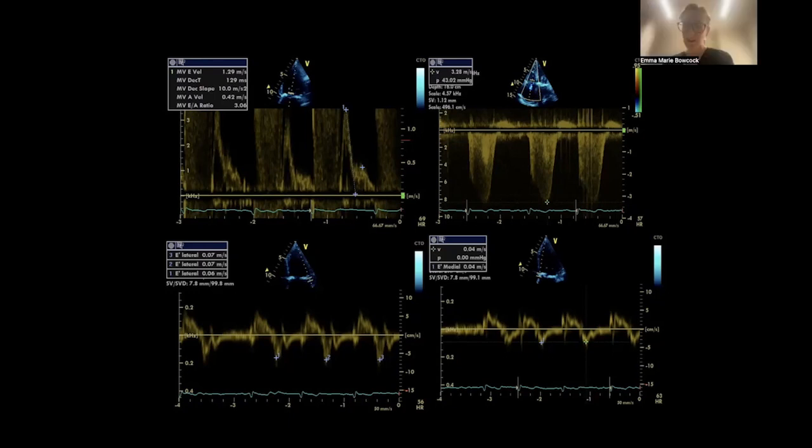Nice, Ben. Really nice. But so you're not going to hang your hat necessarily on the E to A in this, but what other things have you put together? Where are you going down in your algorithm with her diastolic? So it's severe diastolic dysfunction with her TR velocity and her septal and lateral E primes. We know about a huge left atrium, so that ticks those boxes.